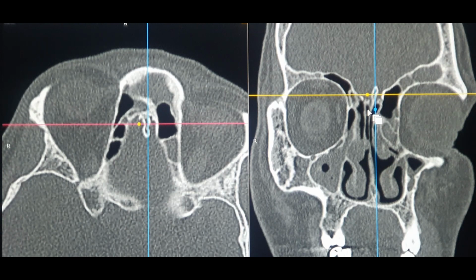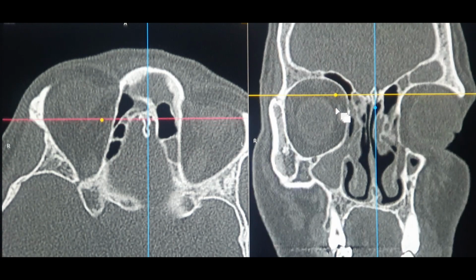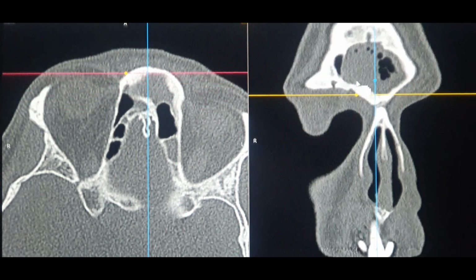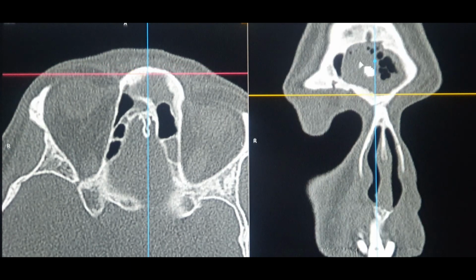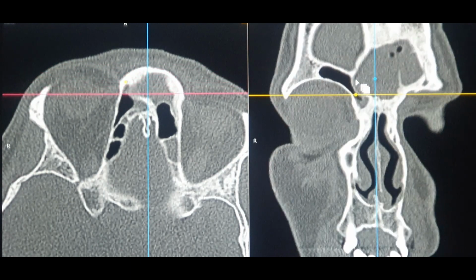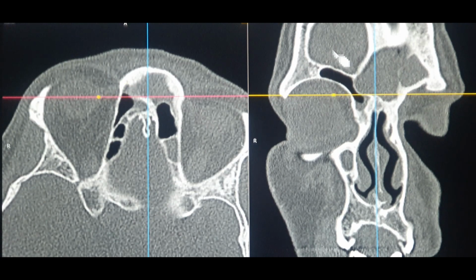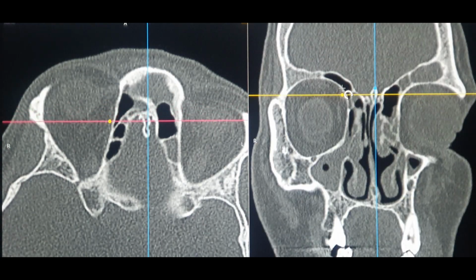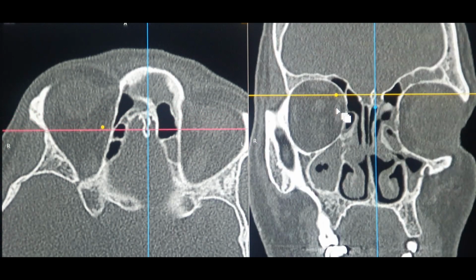Now the crista galli is always behind the frontal sinus. Remember that it will never be at the level of the frontal sinus. It will always be behind the frontal sinus. If you take a sagittal section, you can always see that same thing in the coronal section as well. Anteriorly you can see the frontal table, the anterior wall of the frontal sinus. Posteriorly you see the sinus coming in the picture, and then eventually keep on going behind. You can start seeing the frontal lobe of the brain. You can see the frontal sinus terminating into a supraorbital cell over here, and then eventually it goes off.